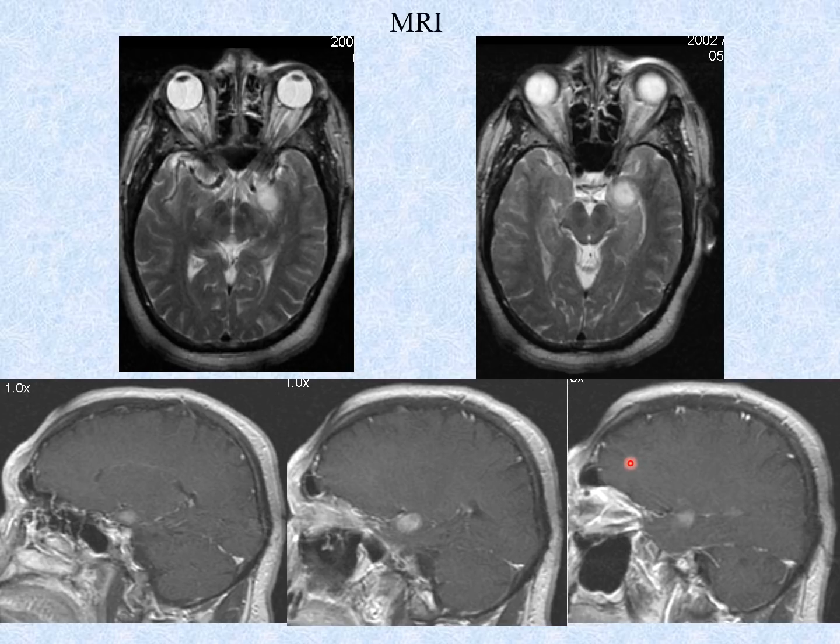Here we see an MRI from a tumor that's in the temporal lobe, here in the medial portion of the temporal lobe. Remember, we're looking right, that means the left, in the left temporal lobe, and this is in the hippocampus and amygdala. And we can see it here on the axial section, and recognize this is a T2 axial section because we see that the vitreous is white. And we also can see the same mass in these sagittal sections.